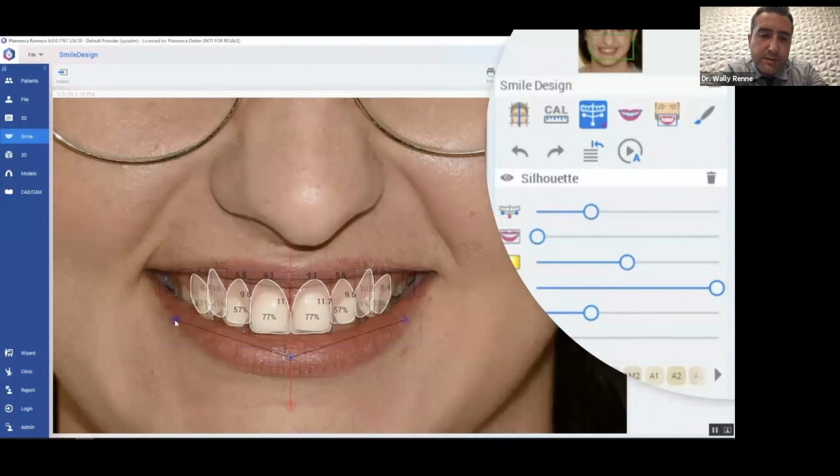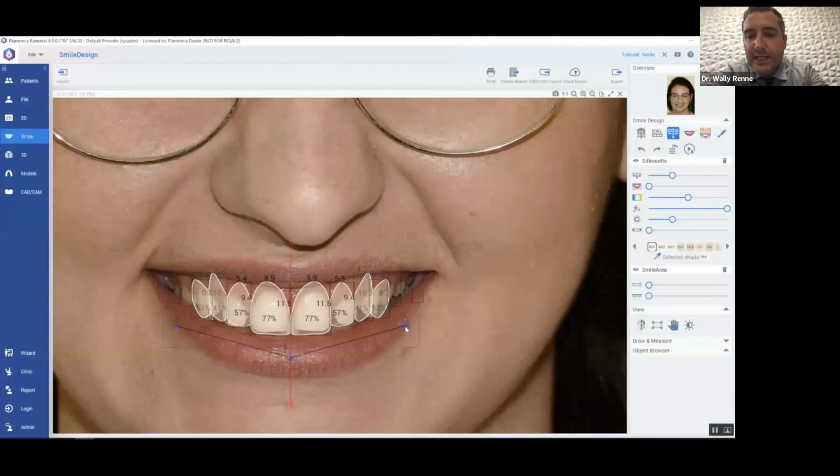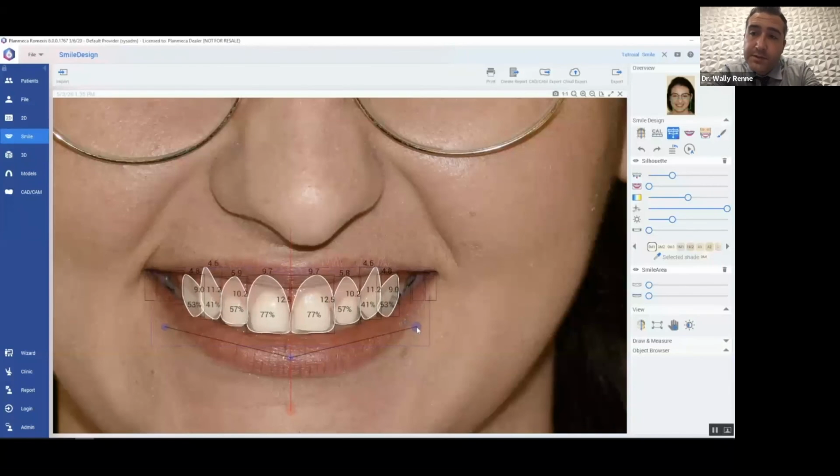So now we're going to the two silhouettes. We've already done facial measurements, and we're trying to get the teeth in that 10 to 11 millimeter long ballpark range for her, because she has around 9 millimeter long teeth. And we know that we really can't lengthen them incisally because she has basically a short upper lip. So if you lengthen them incisally, it's not going to be good for her repose, for her relaxed look. She's going to look even more toothy. So we're going to try to lengthen them a little bit gingivally, so maybe just a millimeter.